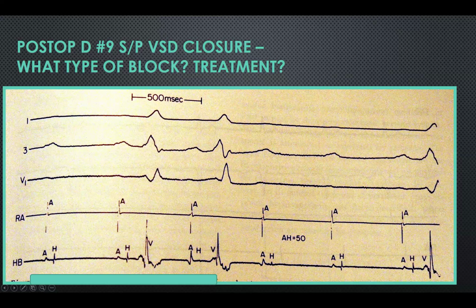Second degree heart block. And is this Mobitz 1 or Mobitz 2? Mobitz 2. Yeah, this is Mobitz 2 heart block, where we have the AV node working, but the His-Purkinje system is not. And this is, by the way, the most common type of block we see in postoperative heart block. I mean, when you get heart block after surgery, you get knocked out both in the AV node and the His-Purkinje, but there's always His-Purkinje disease when we see high-grade block following surgery.